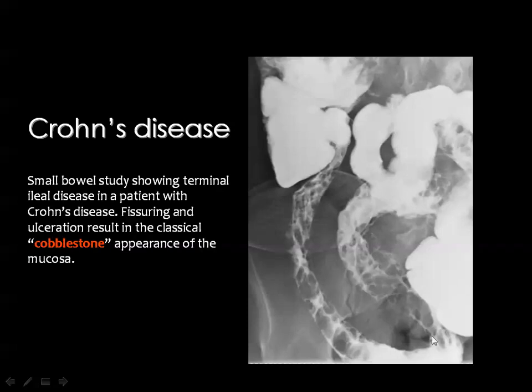One of the criteria of Crohn's disease in the terminal ileum is what is known as the cobblestone appearance. This cobblestone appearance is the result of the disease causing damage to the mucosa and ulceration of the mucosa. Then the healthy mucosa will hypertrophy to compensate for the function of the damaged mucosa, and this hypertrophied mucosal island will result in this cobblestone configuration.